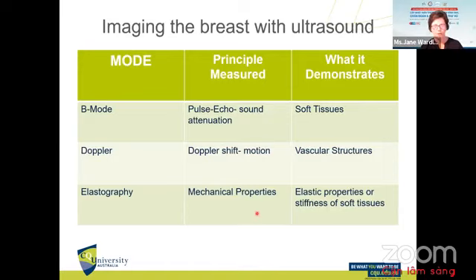But B-mode imaging of the breast will give you lots of information as to the features of the masses, and give you an idea as to whether they're benign or malignant. The Doppler will demonstrate vascular supply. Often our breast carcinomas do have a vascular supply, so you will see colour Doppler within the mass.